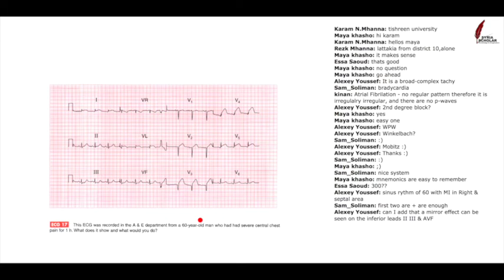We'll skip through, as I said before. You should always do your system, but now we're looking at the ST segments, so let's skip right to the ST segments. Can anyone see what the problem with this patient's ST segments is? Is it in the inferior, lateral, or anterior part of the heart?